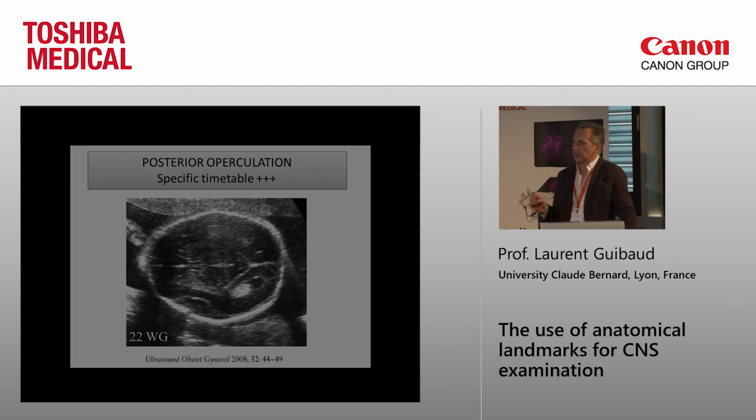And why do you have to look at the Sylvian fissure? Because from my point of view, to have a look at all the gyration is a waste of time, because there is inter-individual variation for secondary sulci, and the Sylvian fissure is very, very simple. You have this under your eyes, and look at the posterior part of the Sylvian fissure.